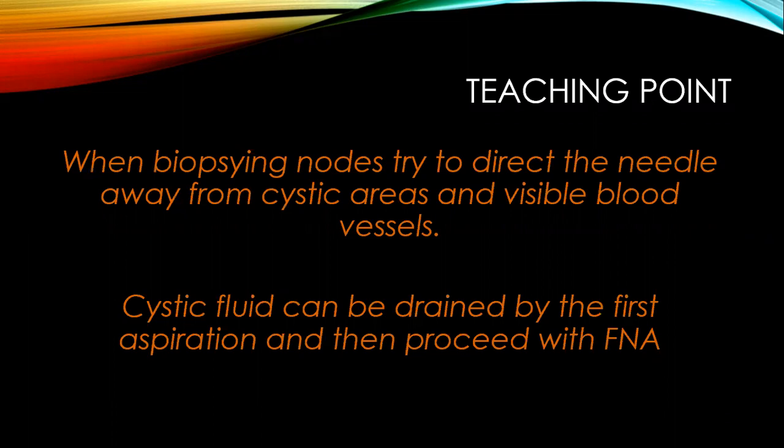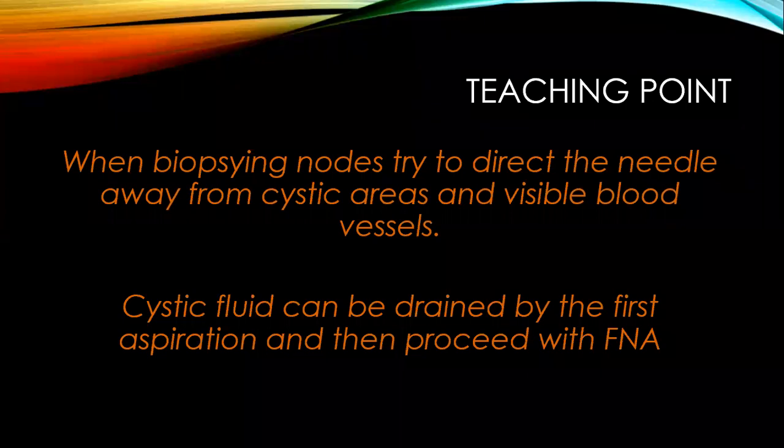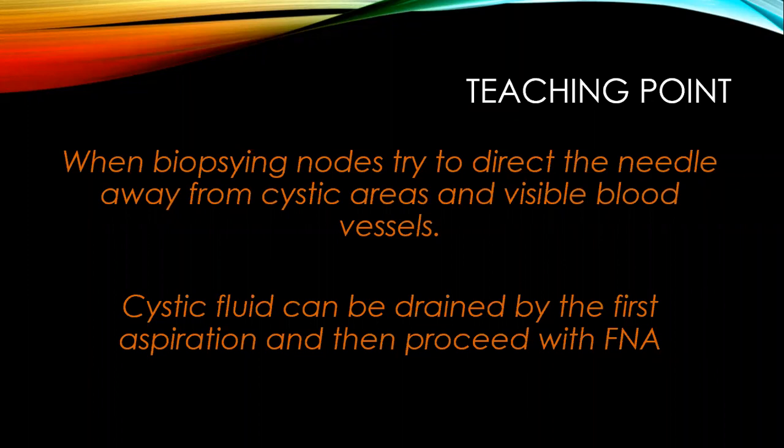So it is advisable that when we are biopsying our nodules, we need to direct our needle away from the cystic areas, because most of the time the cystic areas are due to necrosis. So they won't give us any positive diagnosis on fine needle aspiration cytology. So we need to direct our needle away from the cystic areas, or we can actually just drain the cystic fluid and proceed with our fine needle aspiration. And we also need to direct it away from visible blood vessels so that we avoid hemorrhage and complications during the procedure.